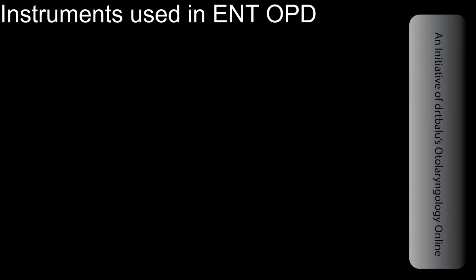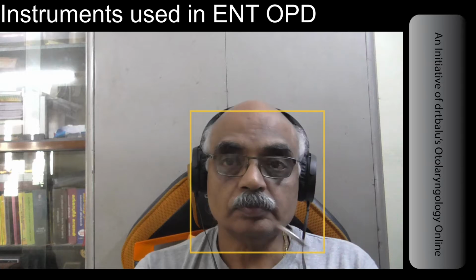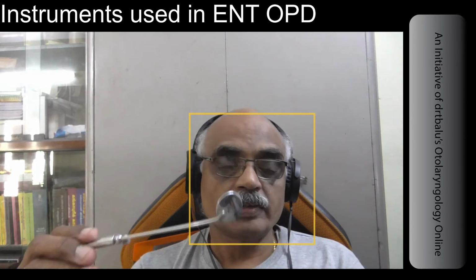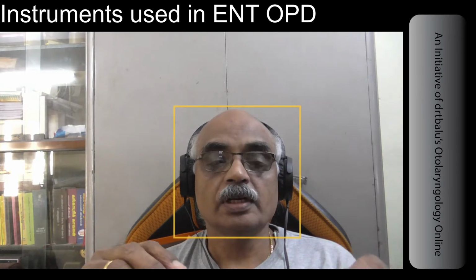Or you can carry your butane cigarette lighter. As I have been telling you, it is always imperative to warm the mirror surface rather than the metal surface.